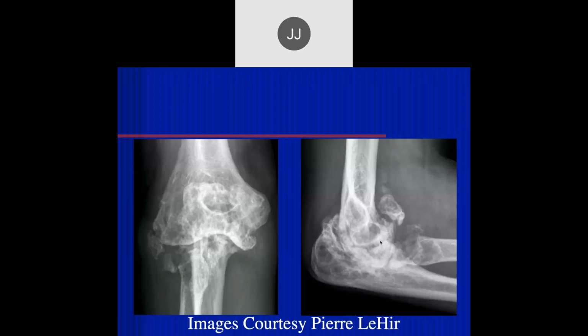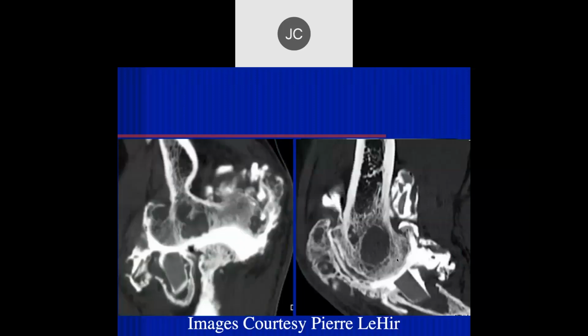Right. Especially your patient. Okay, Elior, what do you think of this case from France? Okay, so radiograph of the elbow, I see a deformity of the elbow joint, destruction of the radial head, fragmentation, joint space destruction. Okay. How about a CT here? Here's a CT.